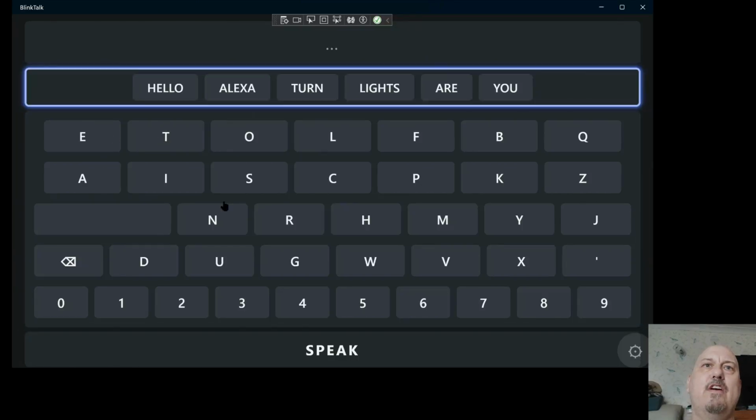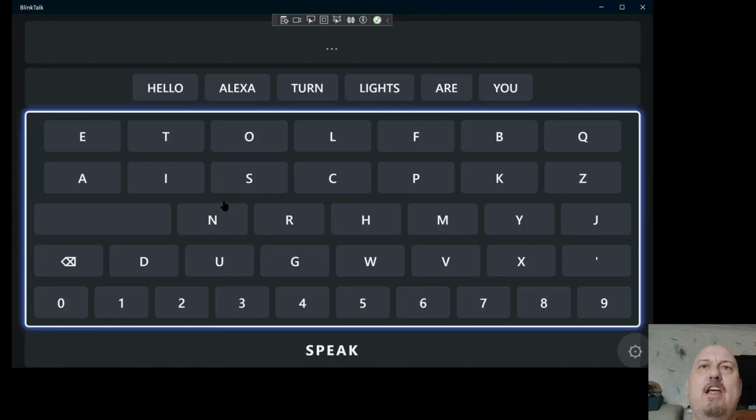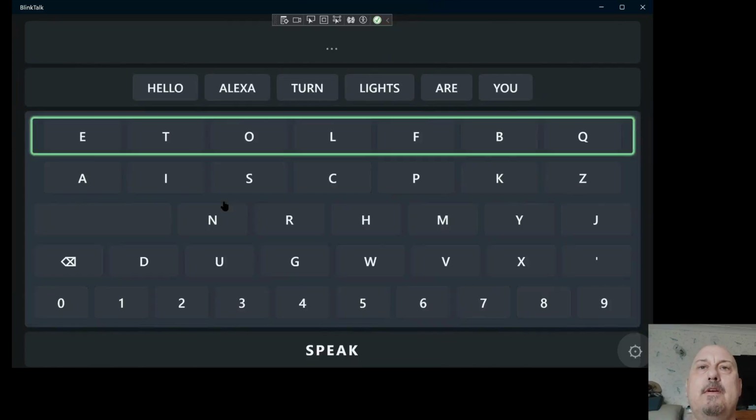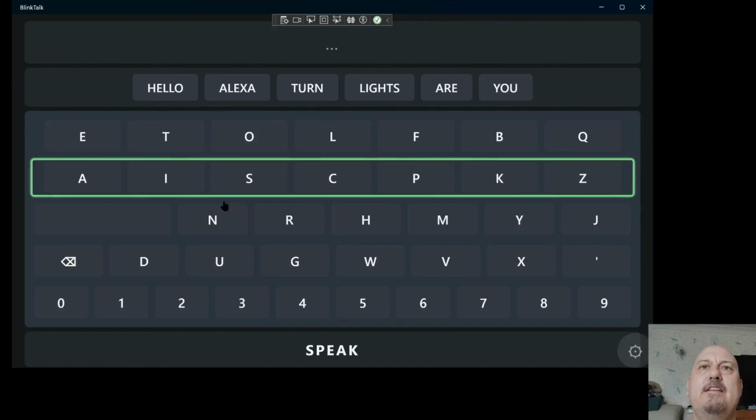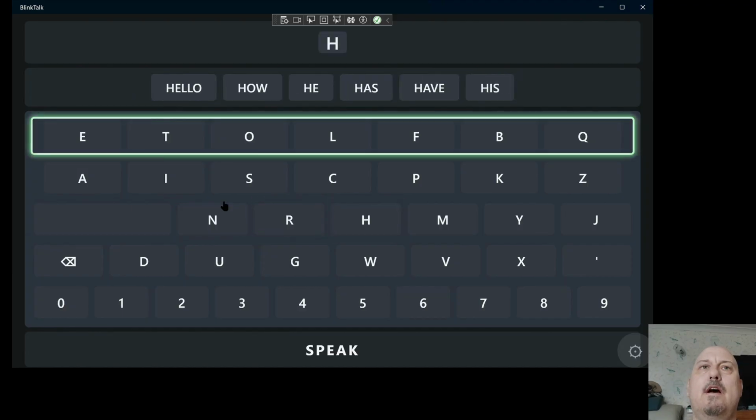So if I wanted to write some words, the idea is that they take a shorter amount of time. So if I write hello, I'll ignore the word hello at the top. I'll pretend I'm typing it for the first time. So I'm going to go down to H. H isn't used all that often, but E, L and O are used often.